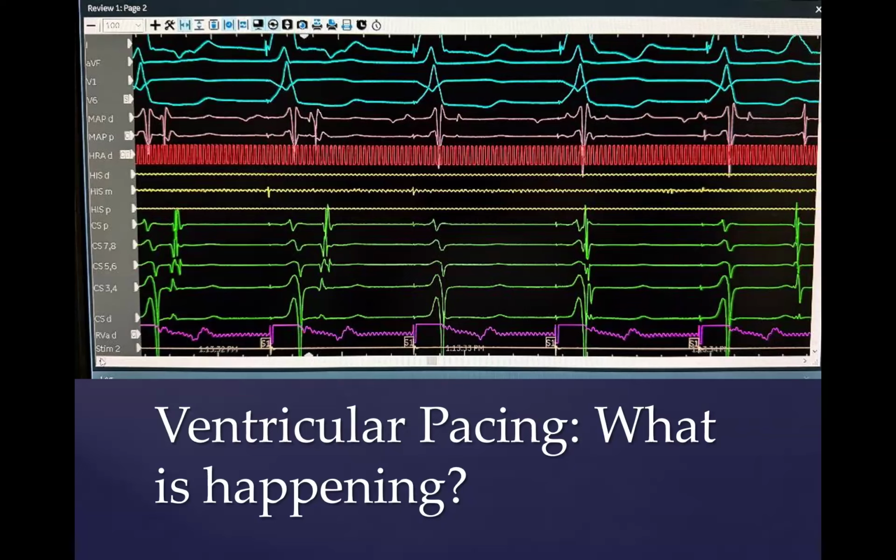What's going on electrically in the atrium when we don't have a pathway and we're not pacing the V? When you get a 12 lead EKG, what rhythm are most patients in? Sinus rhythm. Yeah, right? So these are just sinus beats. Yeah, these are just two sinus beats, and we notice there's no consistent relationship.